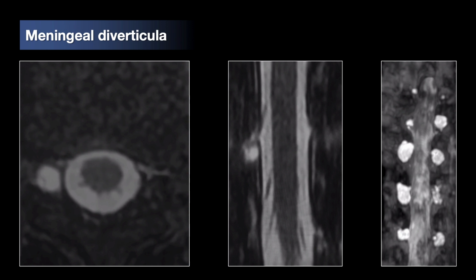And these can be distinguished from perineural cysts, which are common incidental findings, which are in continuity with the nerve root sleeve itself. Remember, these are actually fragile outpouchings of arachnoid mater through that fragile dura, so they're actually occurring at a site of a dural dehiscence.